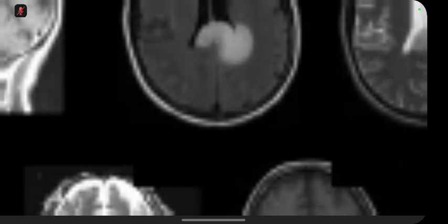So absolutely spot on. Now, the point is that tumefactive MS is a type of MS presentation where there will be a large lesion and you will confuse it as a tumor. It can occur anywhere. But look at this case. Corpus callosum is involved. If you see, there is a rim of restricted diffusion. And classically, they say that active inflammation is towards the white matter. And towards the gray matter, which is this side, there will be less active inflammation. This DWI is quite impressive. This post-contrast is impressive, but not extremely, because a portion of this is also enhancing.